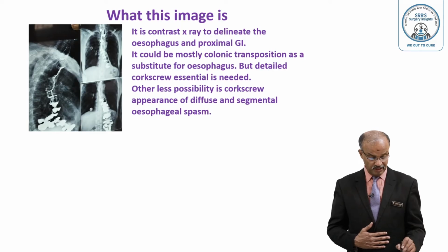So dear students, we'll discuss an image today which you might not have seen regularly. It is a post-operative image, actually a post-major surgery image. Let's see that and identify what it is. It's very interesting. See what this image is.